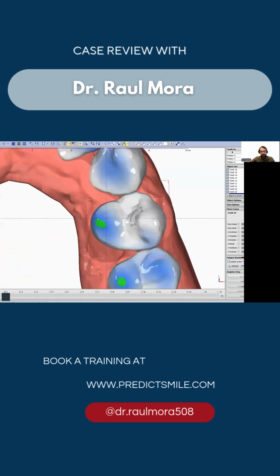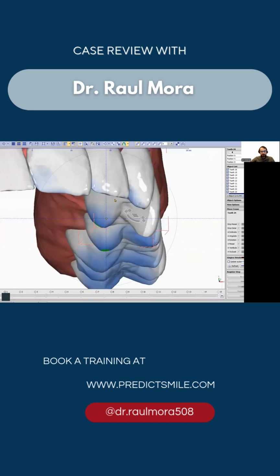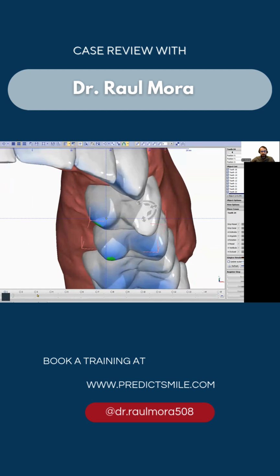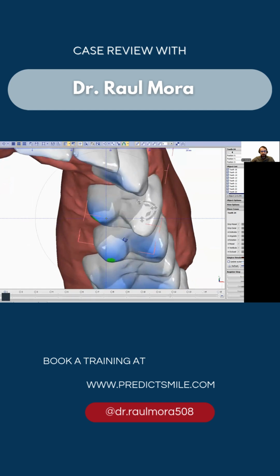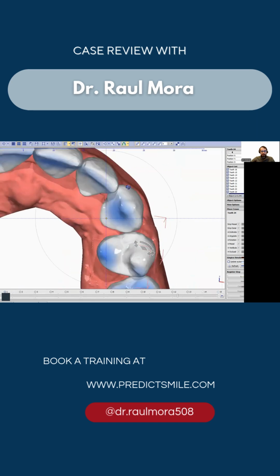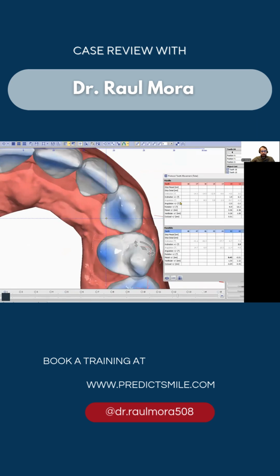So let's see, we start from this premolar. This will also require some space here to create that negative torque. You see that? And by creating that, we don't need to move it buccal, or we just need to give a little bit of torque so we can intrude this cusp a little bit and create some sort of bite jump. So you see, that's what we're looking for. I don't think we need any additional staging here or any special movement. And the canine, let's see how much movement it has.